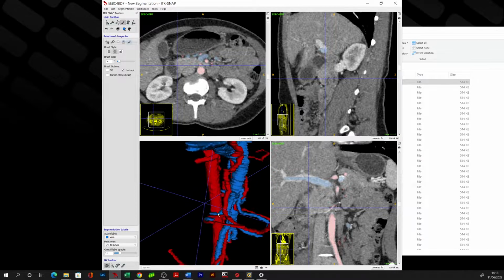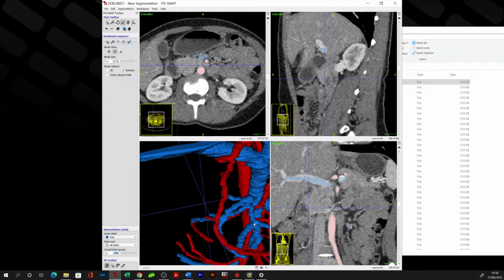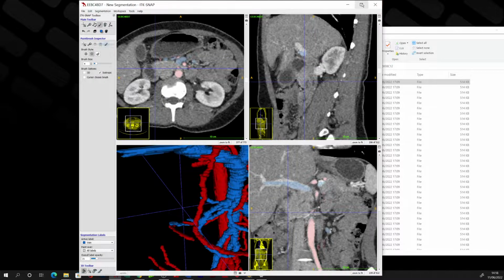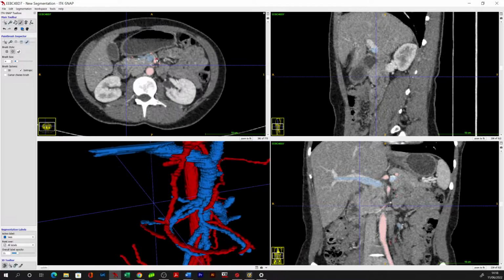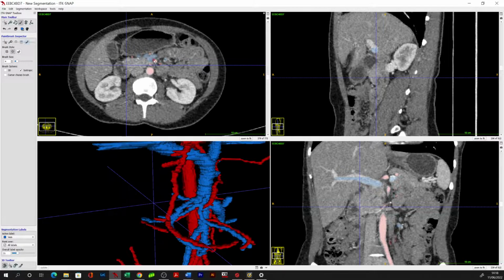The question would be whether this vessel under here is originating from the trunk of Henle proximally, or whether this is just an overlying vessel. And because the scan itself is a little bit tricky in terms of the contrast between these structures, that is quite tricky, and they do blend.